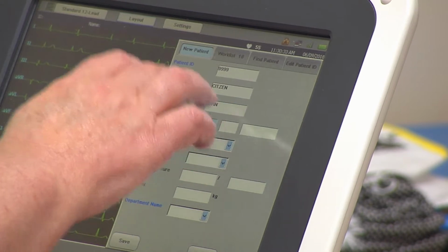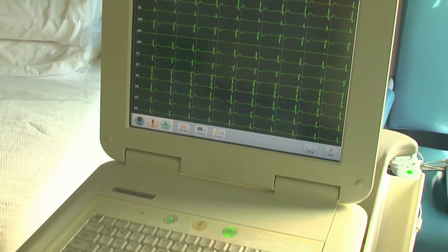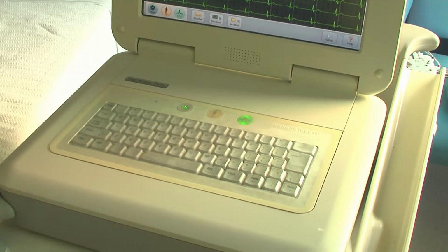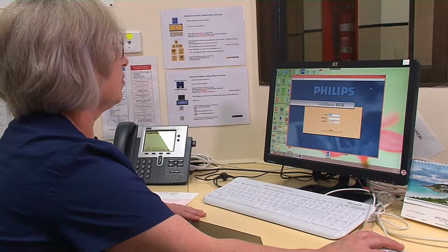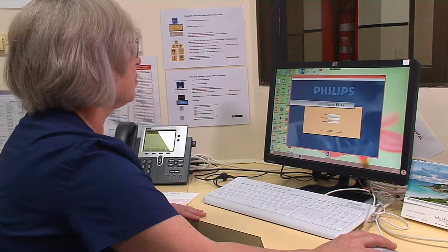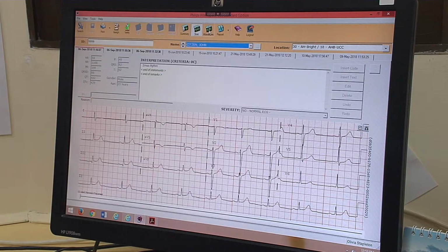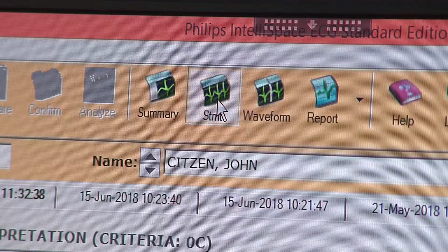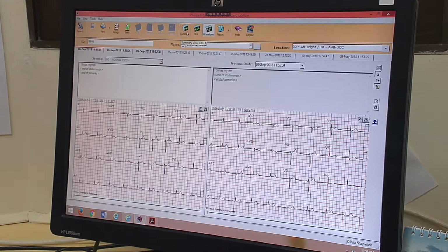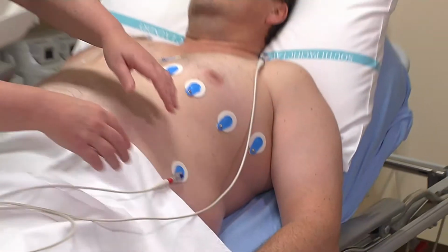your patient gets the clinical benefits of having retrievable digital ECG records, not just at the time of presentation, but also into the future. We will explain the use of the iECG or IntelliSpace ECG, the desktop interface that is used to access digital ECG images stored on a server. Features of iECG include verification of patient details and reporting of ECGs by medical officers.